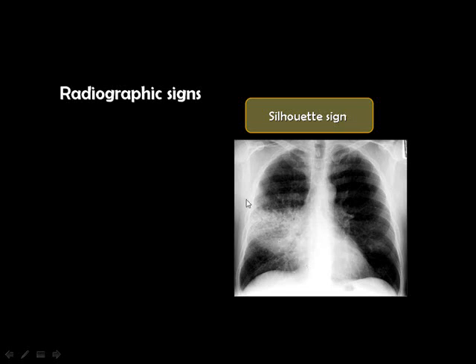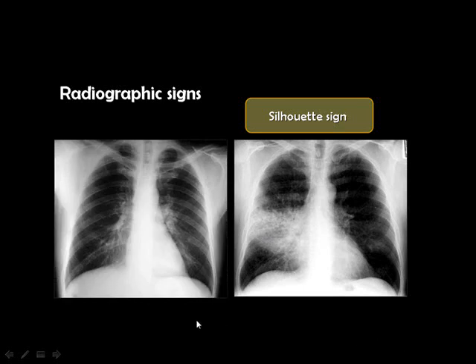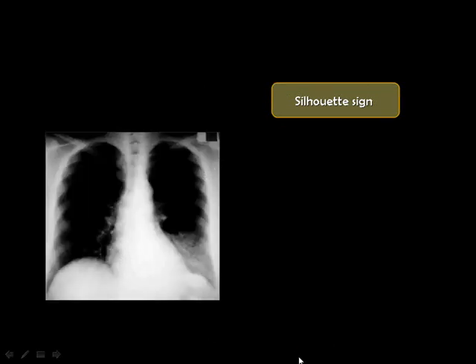And the anterior part of the lung on the right side in this location is the middle lobe, then you know that this lesion is in the middle lobe without the lateral view. Another example, if you see an opacity here, then you look at the cardiac border and you can clearly see the cardiac border through the opacity, then you know that this opacity is not anterior. It is located posterior and it is in the lower lobe, not in the middle lobe.